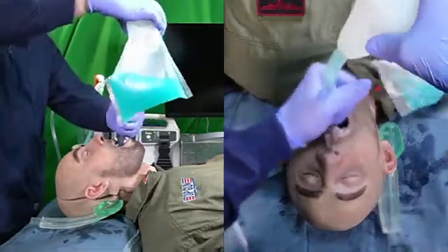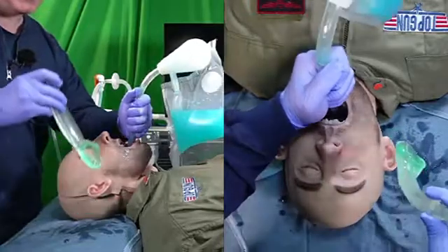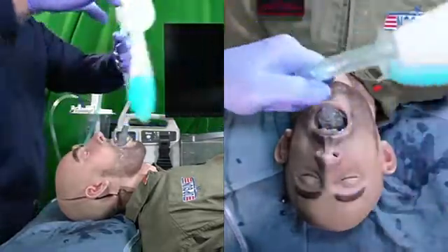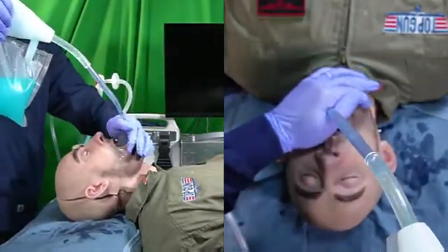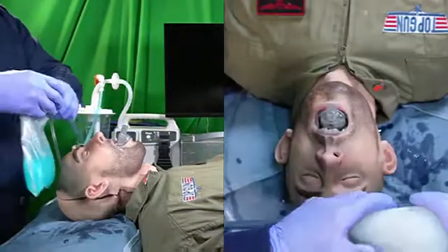What I'm going to do now is push the tongue into the floor of the mouth, distract that base of tongue off the posterior pharyngeal wall, place the supraglottic airway all the way into the mannequin. And now I'm going to perform a rapid airway decontamination maneuver just by using the device to decontaminate the ventilation channel.